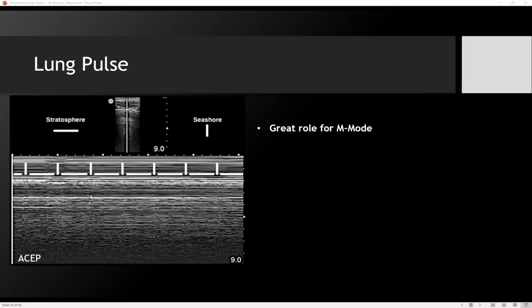So the answer to that first question, where I gave you this exact M mode, is that you could make out that there's a lung pulse and that ruled out a pneumothorax. And this is extremely helpful at the bedside because very often it's there and you don't have to worry about looking for this large bore needle.